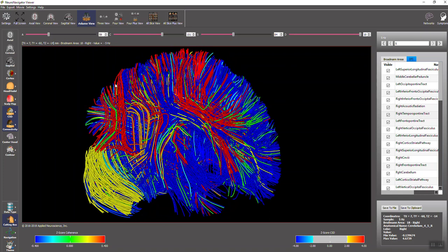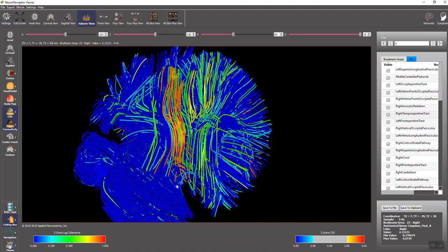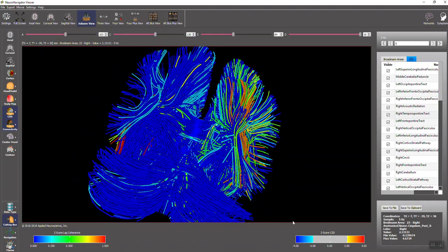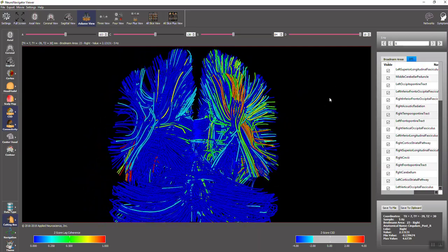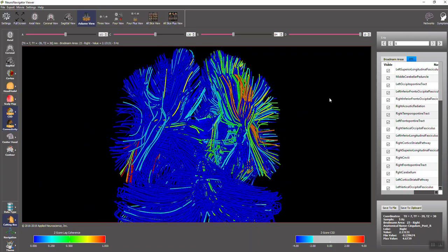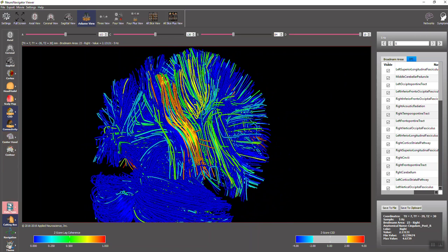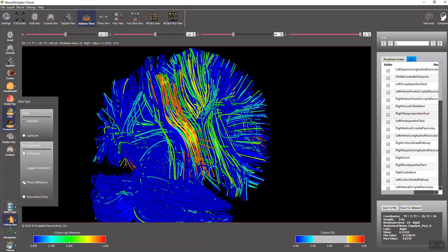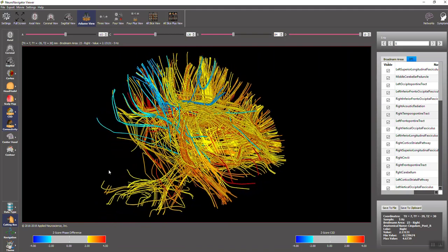And these fiber tracks, these are colored depending on the magnitude of the EEG coherence or connectivity, both functional and effective connectivity. I can look at lag coherence and other connectivity measures. So I straighten it out. I'm going to look at the phase differences. These are the z-score phase differences.